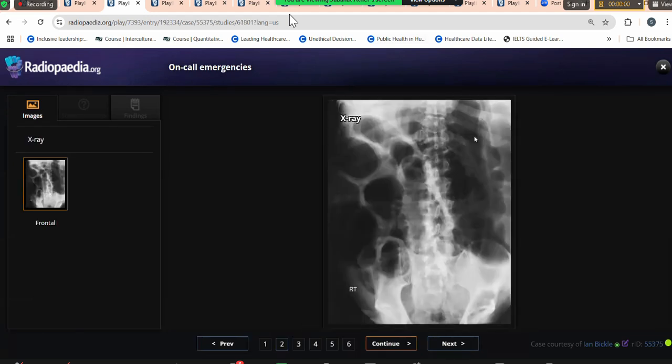So this is the abdominal X-ray, and you told me about the dilated colon, left-sided. Yes. Or if the examiner presses you further, what I wanted you to say is that I cannot see the air distal to the descending colon. That's all. If you would say that, that would make the examiner very happy. But the fact that you said that I can see the dilated colon and the small bowel is good. But this would just get you the brownie points: that suddenly there is tapering off of the air in the left-sided colon after the distal part. Yeah.